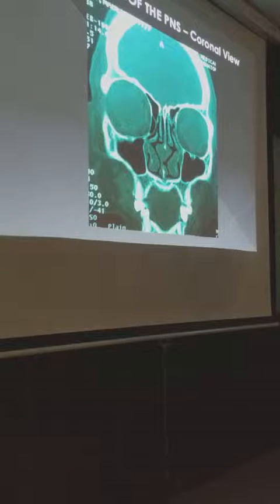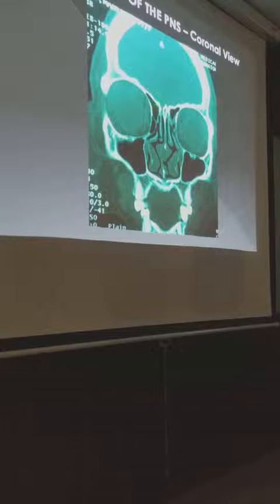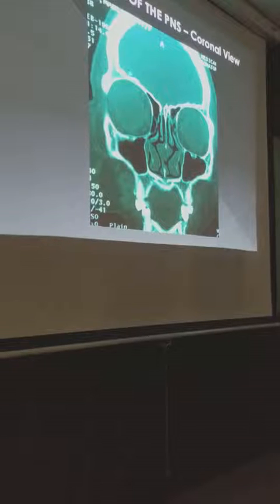Why is that very important? Because it determines the drainage of your frontal sinus. Di ba? If your uncinate process attaches directly to the skull base, then what happens? It will drain lateral to the uncinate process directly into the infundibulum.